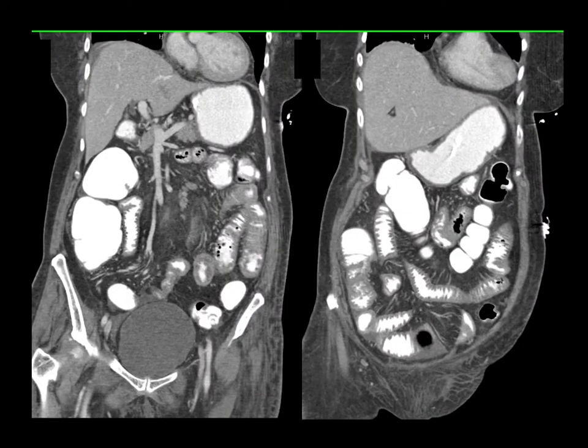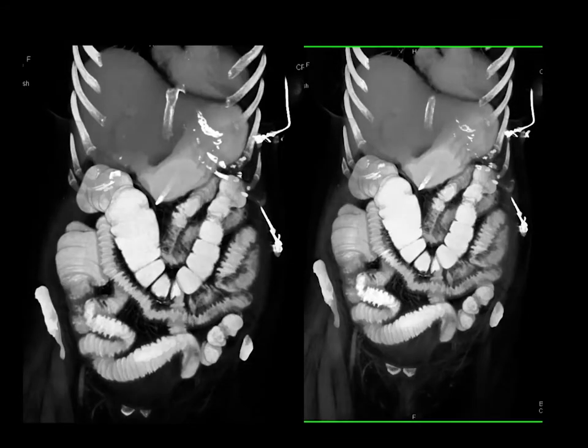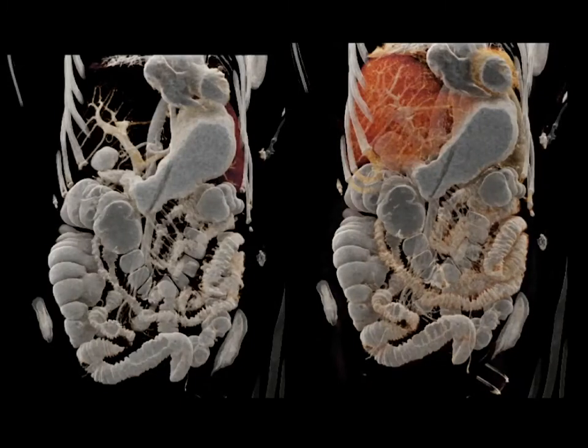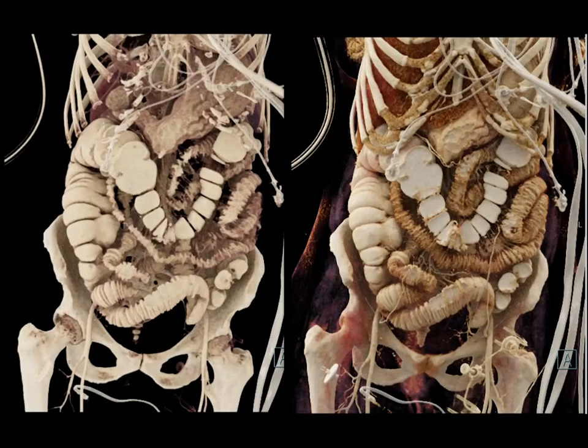The patient has thickened bowel, there's contrast in the bowel. Here it is in grayscale volume rendering, and here it is in color coding where you see both the normal and the diseased bowel. And this made us think perhaps we can use oral contrast and create a very good small bowel series by looking at the fold patterns. So that's something that may prove to be of value.